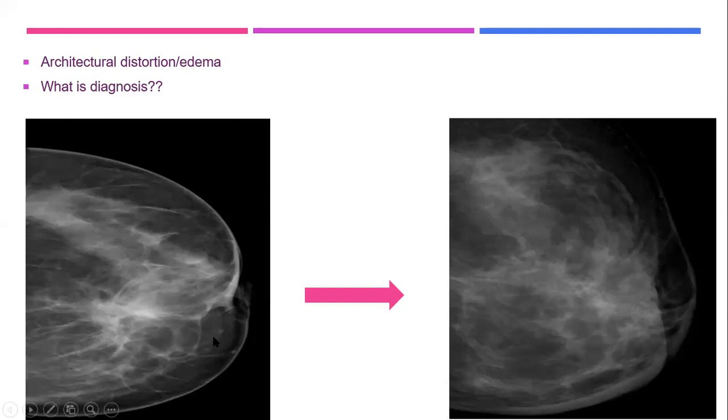You have done this case before, and in an excellent way. I don't know why now you are confused. That is why I said the first image is for you, pre-surgery. Please take it, Abir, because you have taken the same case in a discussion of architectural distortion previously. Same patient, same image.